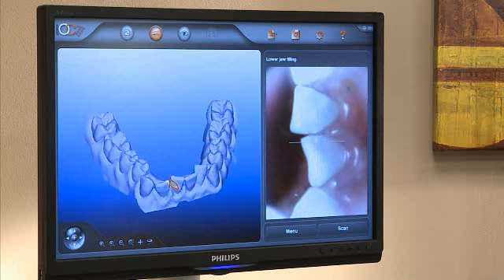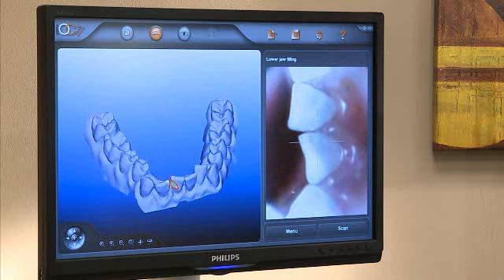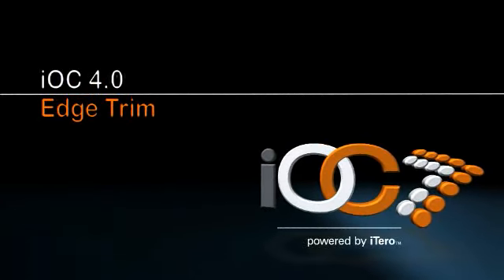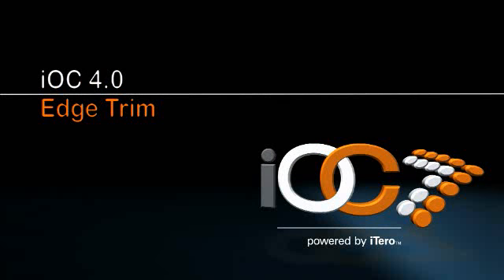As you see, Mike's additional scan automatically fills in the area where he erased in the model. Another useful feature of iOC 4.0 is Edge Trim, which enables you to clean up the edges of your model. You'll find it among the options in the View tool.